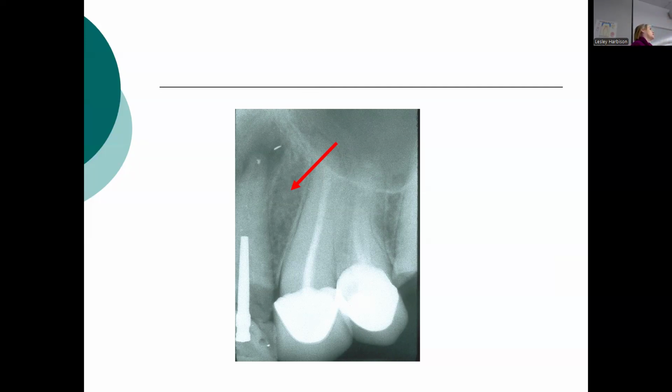And so by process of elimination, you're like, well, that's got to be the lateral fossa because there's nothing else it could be. Yeah.